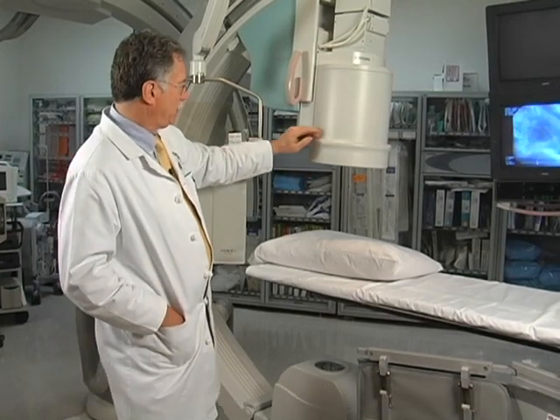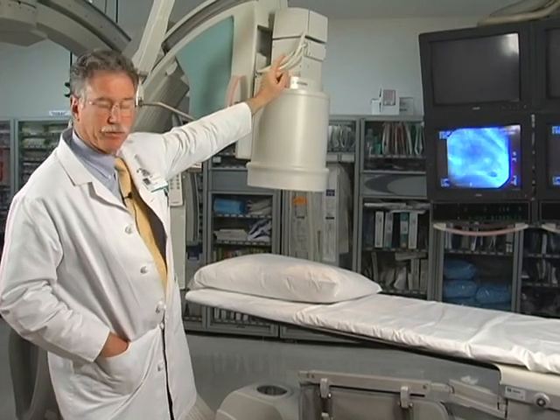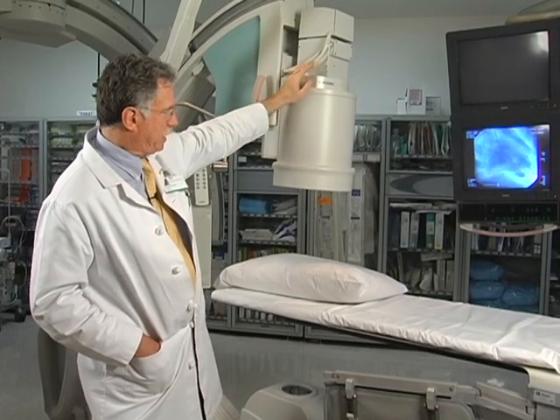The signal of the image is then transmitted to the video chain. It's converted into digital imaging in this system, or it comes directly as a digital image, and is then transmitted to the image display areas, which are in this room 2 video monitors.